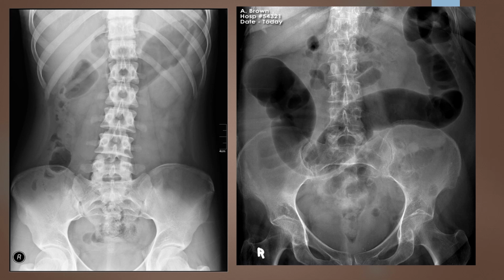So if we look at this abdomen here, number one, we have a digital marker, so we failed our legalities. Hopefully everything else is there, and we might still consider it. Number two, we're going to look at our anatomy. When I look at this, I'm going to say, okay, is this supposed to be an upright? Is it supposed to be a supine? It's not marked anywhere on the image, so I'm going to have to guess what they were trying to do. If the diaphragm is there, it was an upright. It's not. Then it must be a supine. I come down here. The pubic symphysis has to be on the supine.